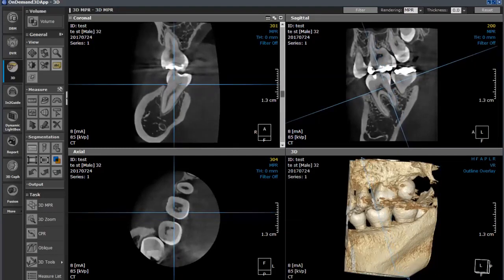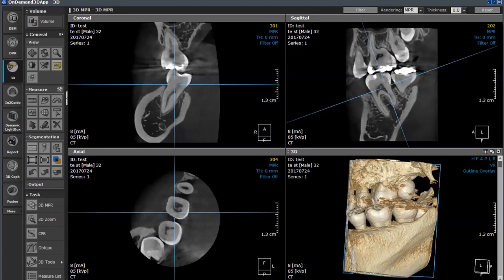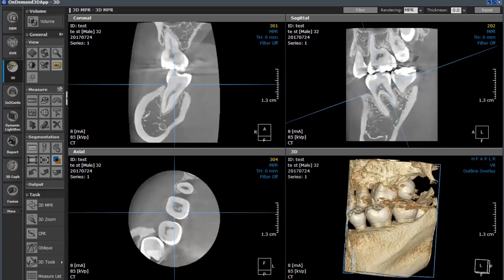Now, a lot of times in free field of view, it's important that I can also do what's called auto windowing. A lot of times with free field of view, it may come out a little bit darker. This will help to brighten it somewhat, so you can get a little more detail and a little more contrast. But again, this gives you the ability to get that higher contrast along the way.